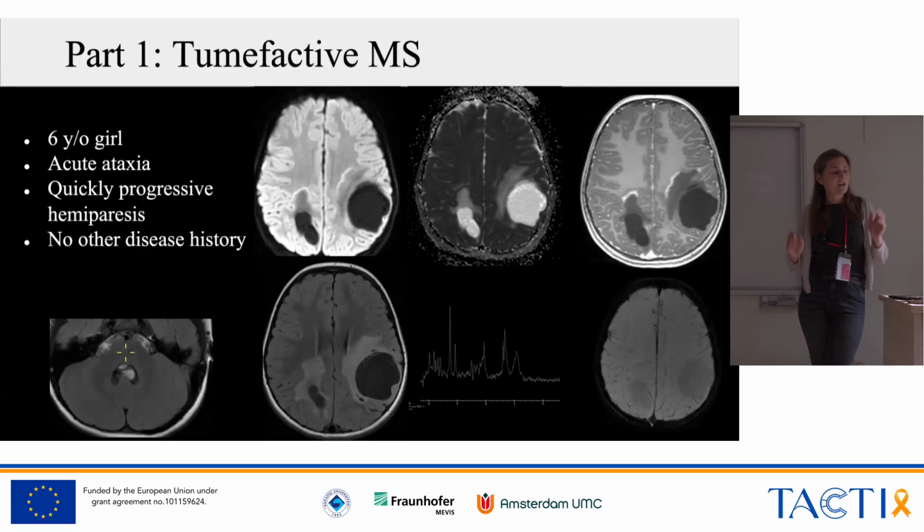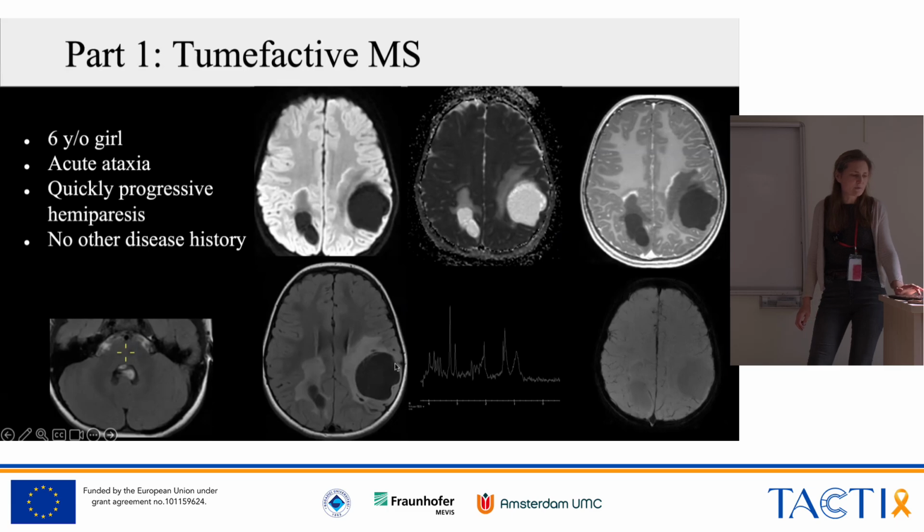But we found those giant lesions in the parietal lobe. As you can see here, it looked like a central cyst or necrosis, but it was all water iso-intense on the T2 weighted images, and also complete suppression of signal on the T2 FLAIR, which means it's like pure water. There was edema around it, and as we can see here on the diffusion weighted images, that was vasogenic edema, and then at the very outer rim of the edema, it was cytotoxic edema, which is proven as this line of diffusion restriction.